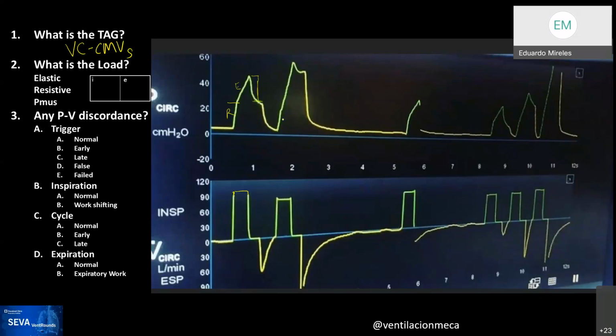In the second breath, the patient barely had any chance to exhale, and now the resistive load looks probably a little bit smaller, but you can see how the steepness of the pressure waveform changed, and this looks even more steep, which goes with the classic event which we're seeing here, which is this multiple trigger.